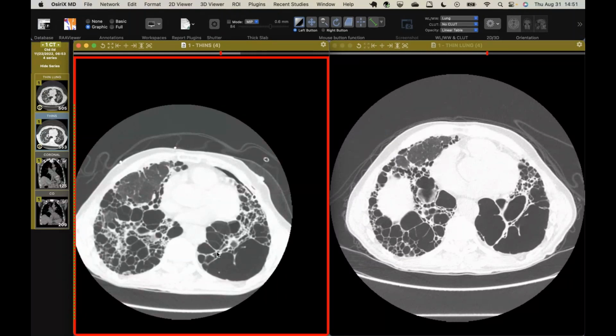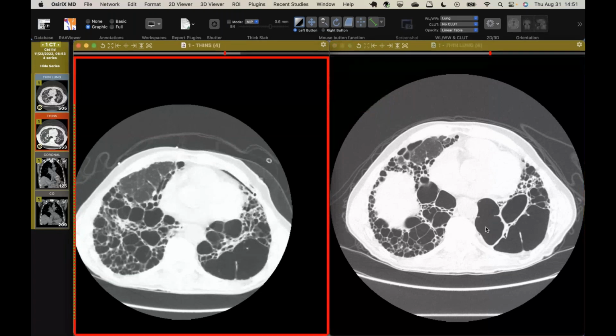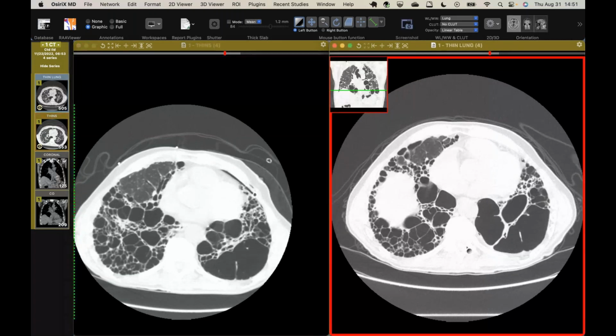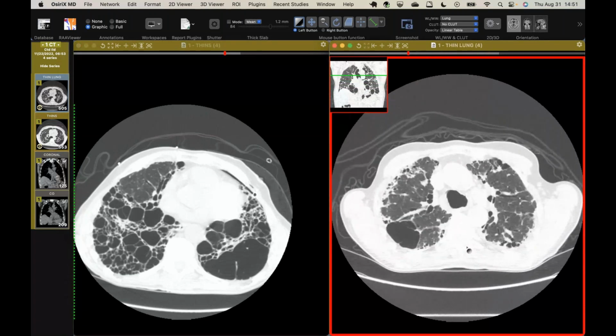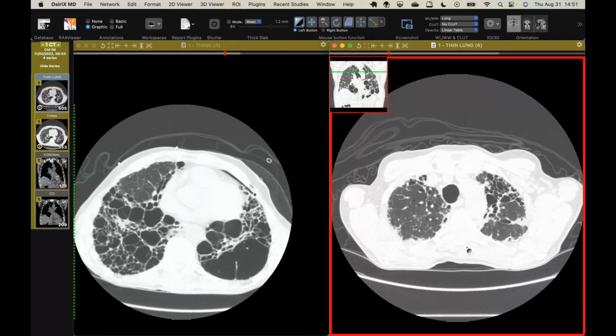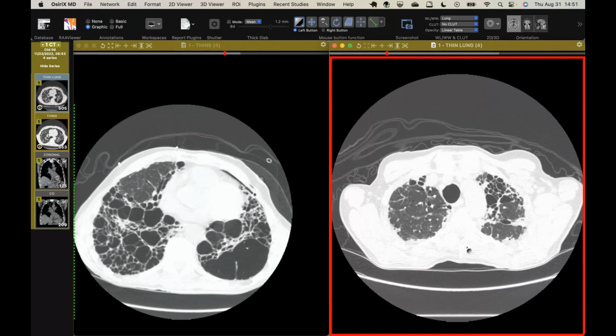We don't necessarily have a lot of imaging on them, but this patient I had at least, I think it was an 18-month time frame between the two. That's one thing I've not noticed, the coalescence of these cystic spaces forming this really large space down here. But when we see this exuberant honeycombing, it's highly suggestive of connective tissue disease, particularly rheumatoid arthritis, which this patient has. Although I just saw one today in a patient with scleroderma that is not quite to this degree, but has what we would call exuberant honeycombing.